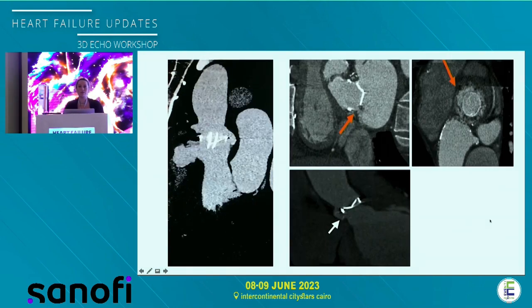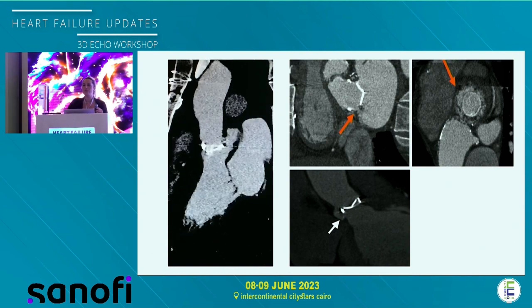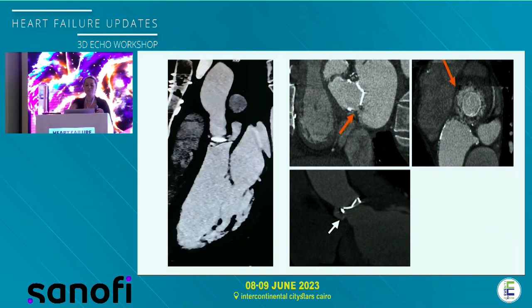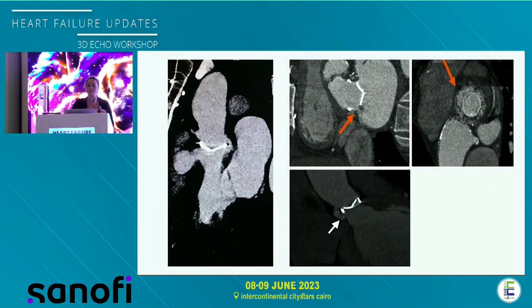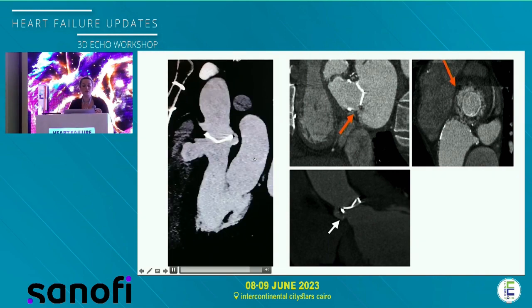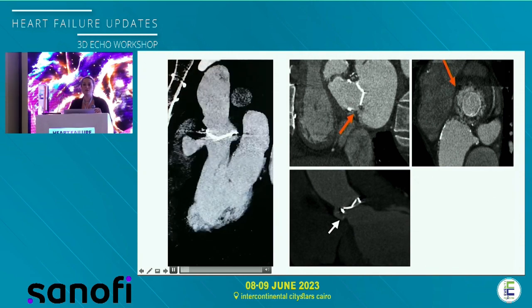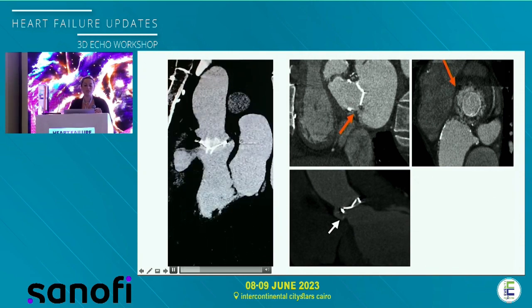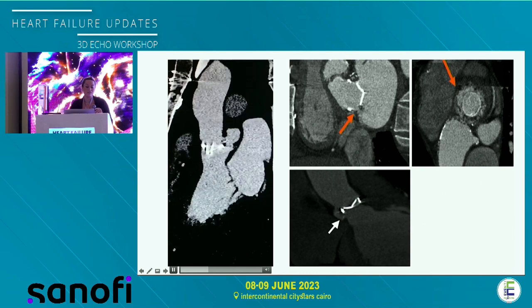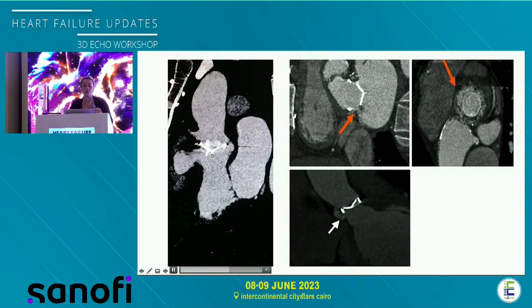It's incredible, and we are utilizing it routinely now for the aortic valves. We use CT, put the angulation there, and we are crossing it very easily. And this is another image. You can see how CT can help you, because sometimes TOE is really very challenging, and I couldn't see, for example in this case, that clearly on the 3D images.